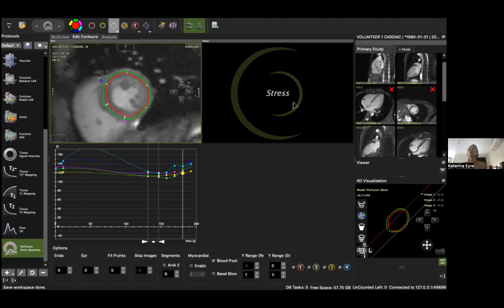Basically you want to have enough cardiac cycles so that you can see a change. If the patient holds their breath for 5 seconds, that's not enough to see anything because you'll just get one value and you won't see the change. It's really the change in values that has meaning. If the patient holds their breath for 30 seconds instead of 40, you can still infer some information from that. But if the patient holds their breath for 10 seconds, sometimes even 15 seconds, it gets a little bit tricky to infer any kind of change in value over time. Okay, thank you.